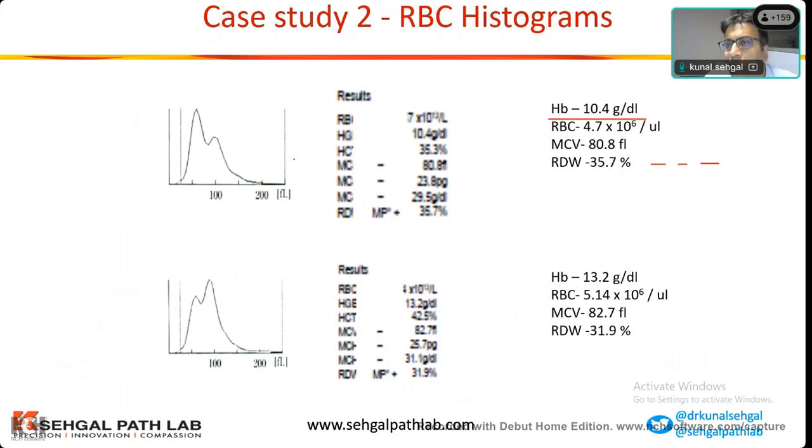So we go to your second point, that this patient was likely iron deficient and this is treatment. Now, this is the same patient, actually, when we go down. What is the difference between the histogram above and below? Both are showing two peaks.